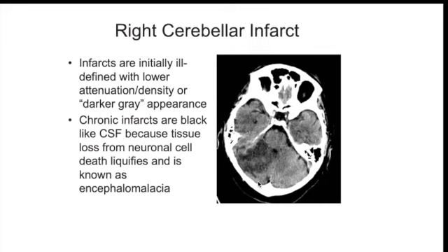So maybe you're asking yourself, does that mean that whenever we're looking at a patient who has an ischemic stroke, an ischemic stroke should appear like this on a CT?